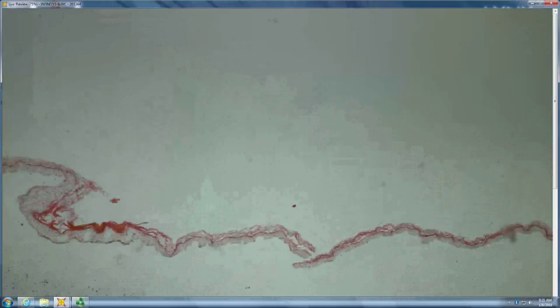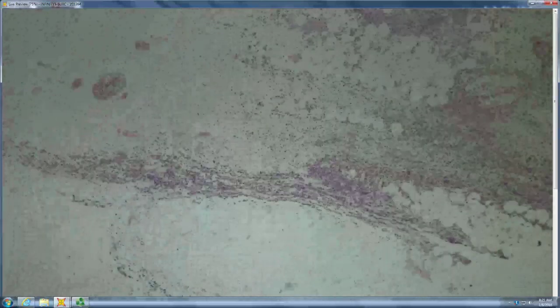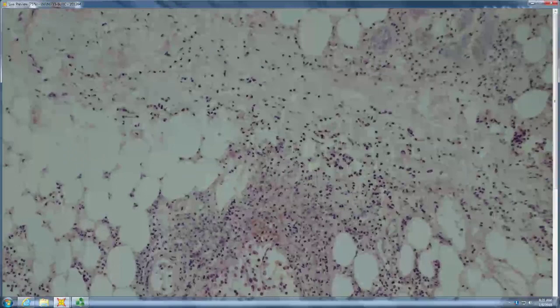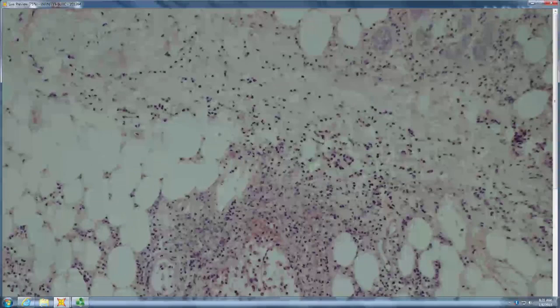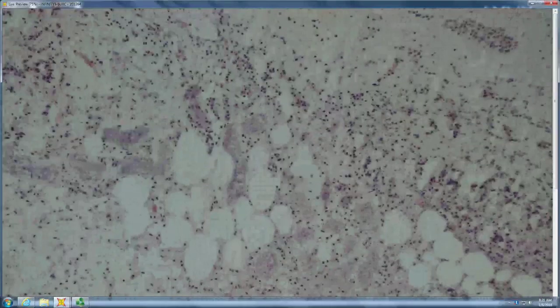So you have epidermal necrosis with slough and a bulla. So this is something that would have been bullous clinically. Lots of inflammation, so it would have been an inflammatory base with a bulla. Goes all the way down into the sub-Q. I almost wonder about something vasculotropic. Yeah, there's vascular necrosis, so you'd worry about things like fusariosis, Mucor. Absolutely. Any of the vasculotropic fungal organisms.